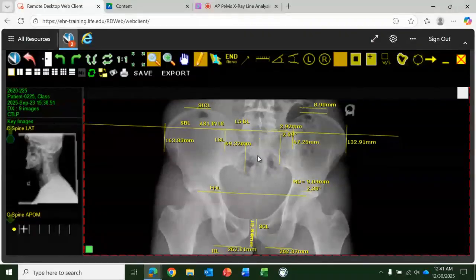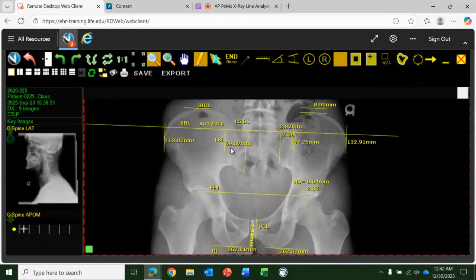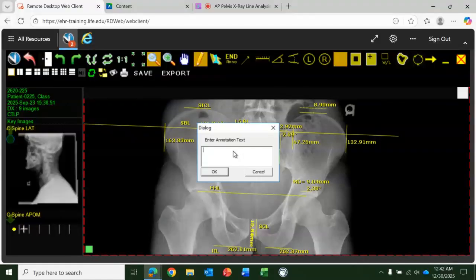Now we have to analyze sacrum. The measurements have been made from the first sacral tubercle to the lateral sacral line. We have 69 on the left and 67 on the right. The larger is on the left, so that is a PL. The difference is 2: 67, 68, 69. So this is a PL-2.